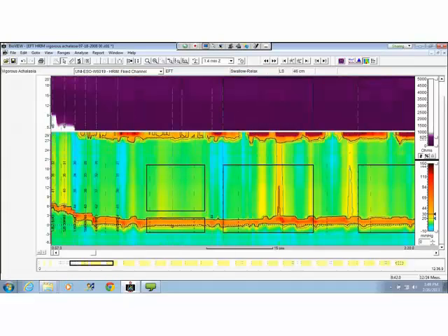Here's one, for example, where the UES opening occurred here. The striated muscle fired here. And there is no pressurization below that, but there's a delayed pressurization out here. This one we would not measure traditionally, nor would we measure that with the Chicago measurements. So follow the same rules that you would use for traditional editing when you're making your Chicago measurements. Thanks, Leanne.